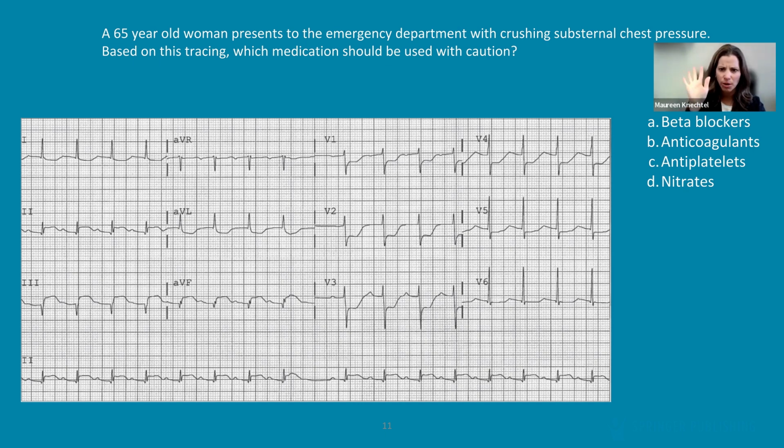So we're taking the vantage point when we look at an EKG upside down. We're saying, I'm going to look at the backside of the heart and I'm going to look at the anterior leads. So you can imagine that if you were to take V1 through V4 and flip this EKG up, it would look just like ST segment elevation. And so that's telling you that there's pretty significant damage there that's ongoing. So this is telling you about that right coronary artery wrapping around, supplying the posterior wall, and the potential for right ventricular involvement as well. So that's what posterior ischemia tells us.